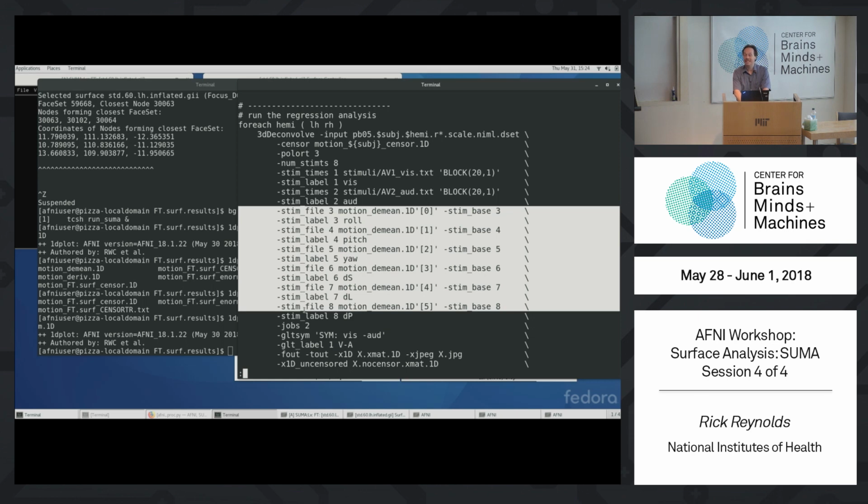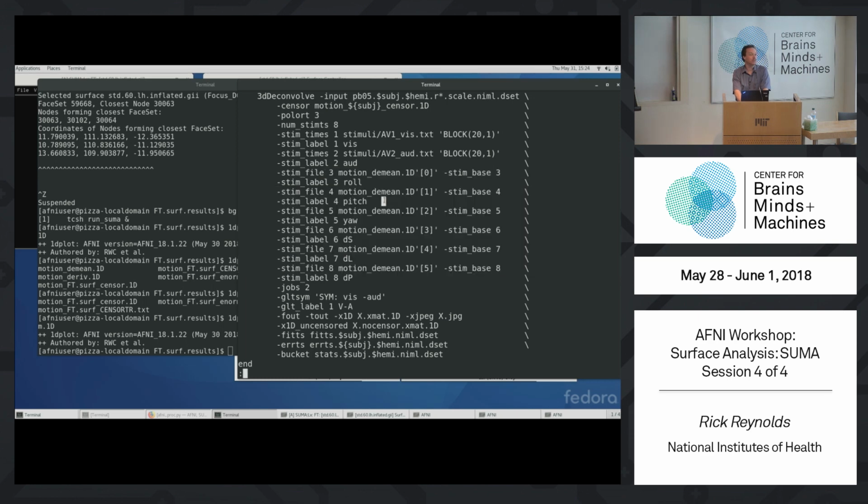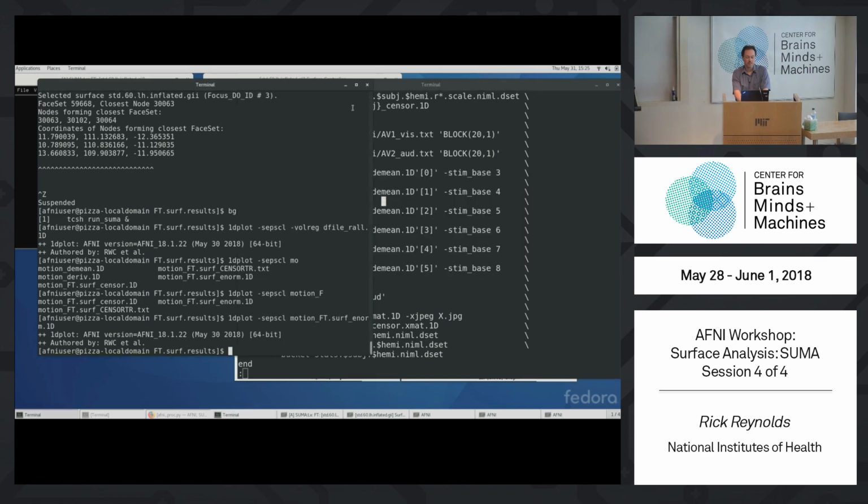Same, that's right. This is the exact same regression as Tuesday, except now the data is sitting in the surface domain. So the whole model is identical. We should see all the same numbers in the same ranges, give or take, except the results may be similar or different. Hopefully a little better in some way. That's why we would do something on the surface.